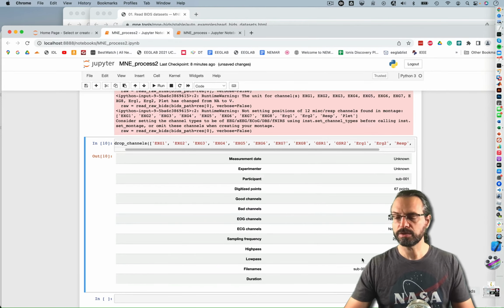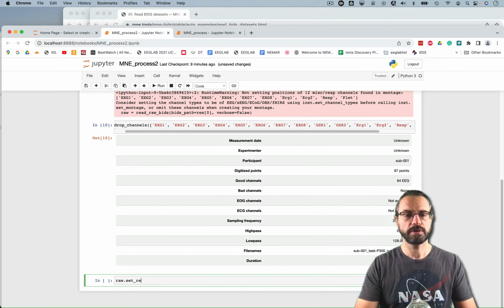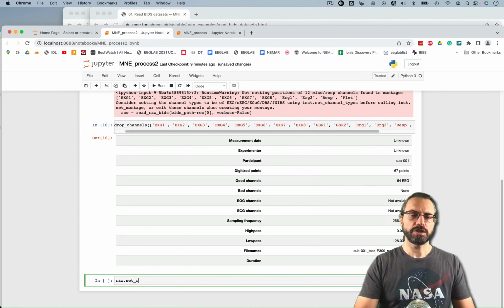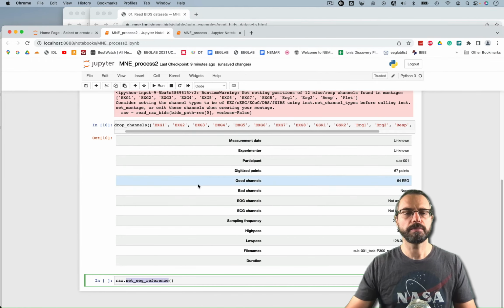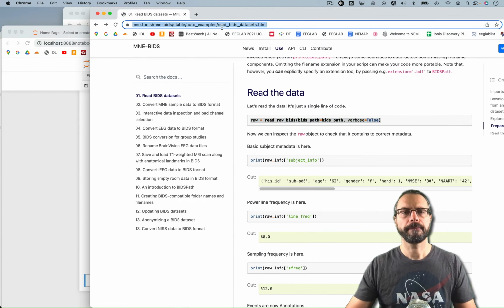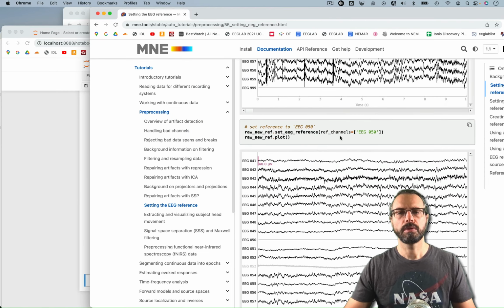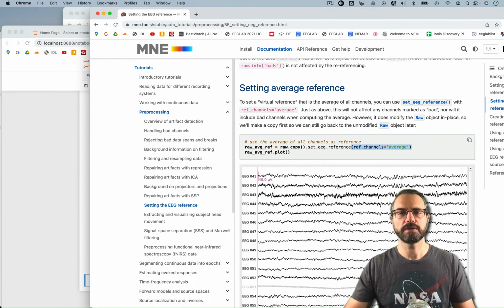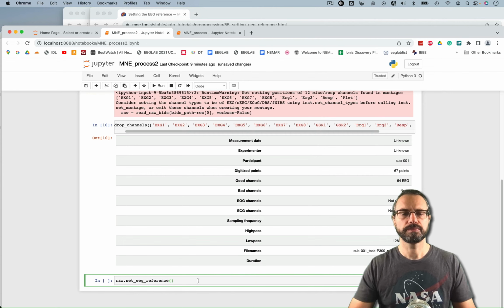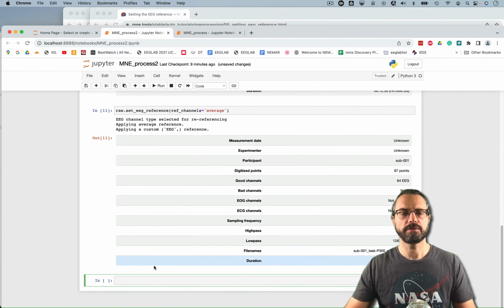The next step is, I like to set the reference. So I think it's set EEG reference. Then let's look it up. Ref channels, I think it's average. Ref channels average. Okay, I've set the reference.